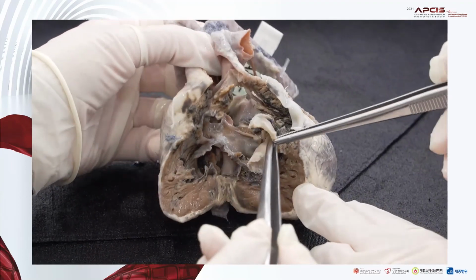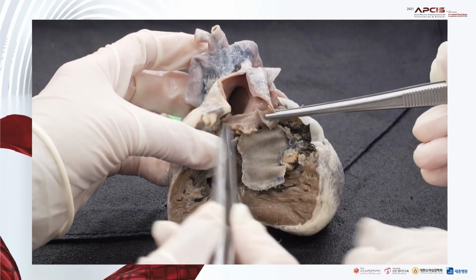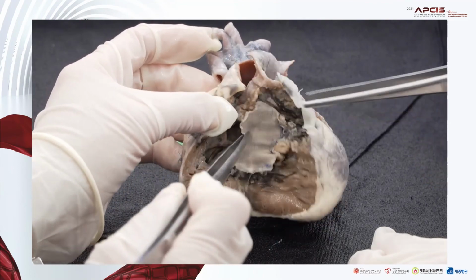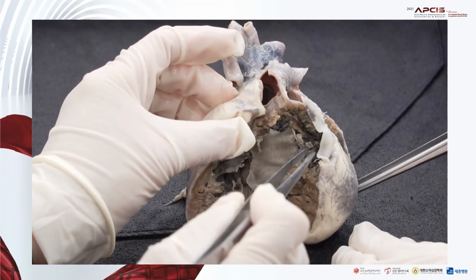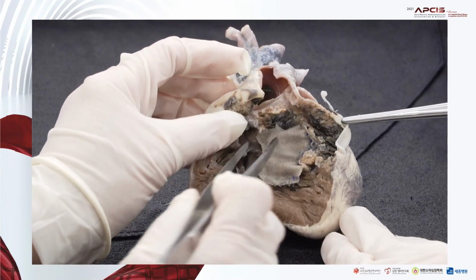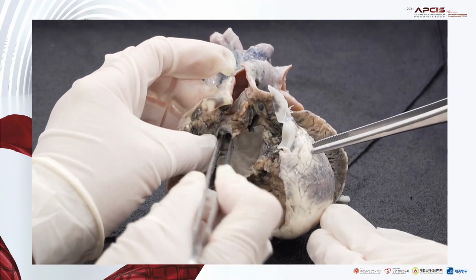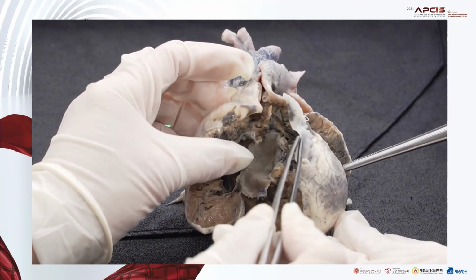And this one is very big. See? The pulmonary trunk originates from the right ventricle here, like this. But I guess the subpulmonic portion is narrow because this patch makes the way from the left ventricle to the ascending aorta. So the subpulmonic outflow portion is small.